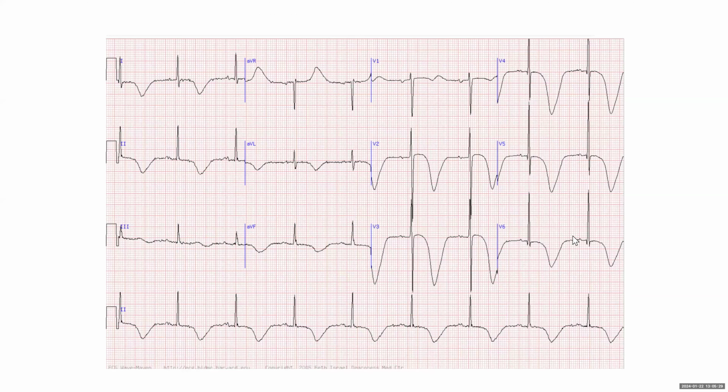So what is the major finding here? You can text in the chat. I think we decided not to, just to make it clear for the recording, write the answer in the chat box. So what's the major finding here?